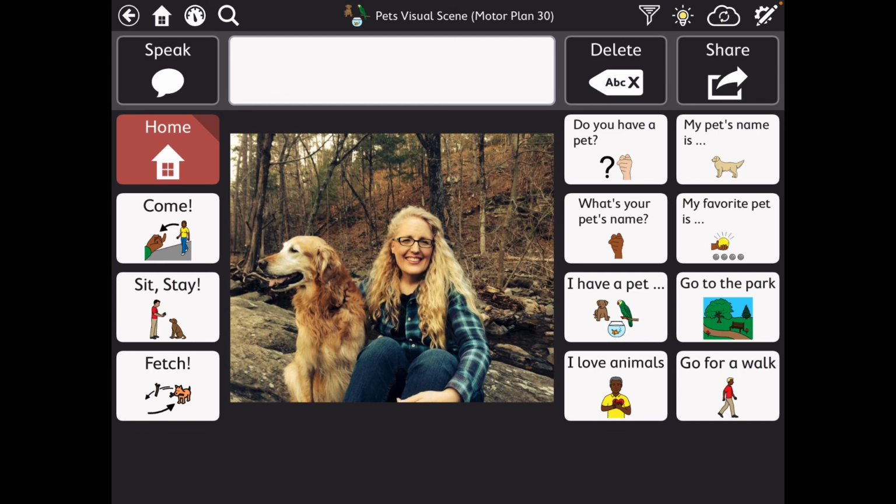Anyway, excited. And so even though it's not available yet with USA wording, our vocabulary, what we would call things, we can still see what this looks like now.